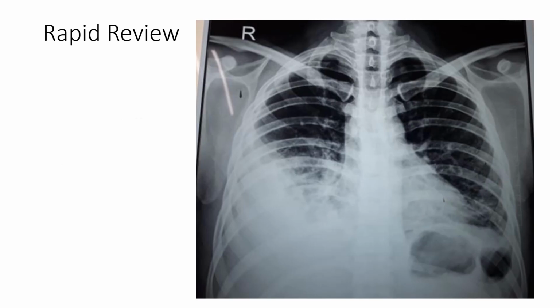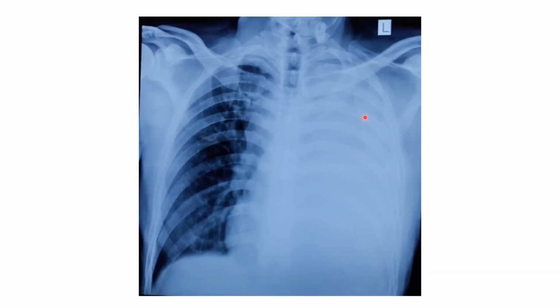Let's see a couple of X-rays so that you become very familiar with pleural effusion. So this X-ray, you can very well note, compare this side with the right side. Here both CP angles are obliterated, and then you have a dependent opacity with lateral upward sloping. So this indicates pleural effusion. Again, complete white-out and shift of the trachea and mediastinum to the opposite side. Massive pleural effusion.